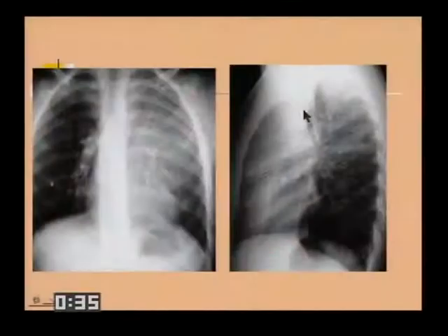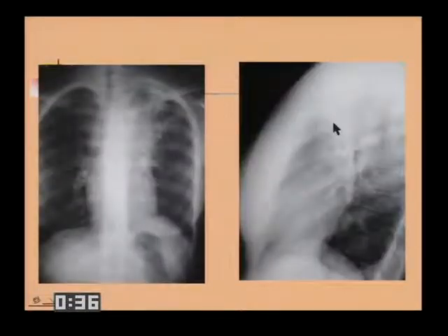Something that simulates this is just a typical left upper lobe atelectasis. In this case, you've got the density going from the base of the lung down by the diaphragm up. It's very clearly defined because you've got the edge of the major fissure. It's a lovely demonstration of how far up the superior segment of the lower lobe can come. But in many ways, this looks like a much more worrisome film on the frontal than the last one did here.